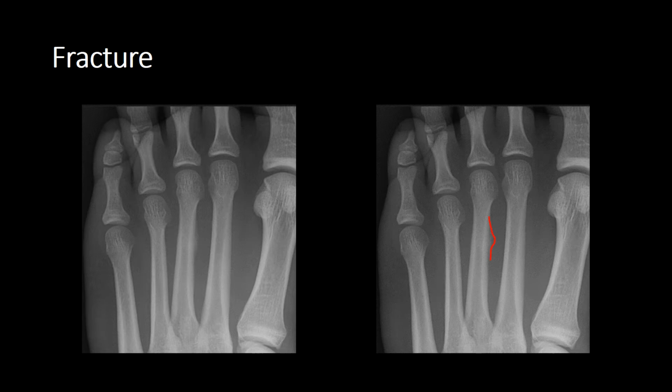What happens is that the body identifies areas of weakness, and so it tries to build up new bone formation to make that area stronger. However, during the process of building new bone formation, in that small window, it's actually weaker. And you get this periosteal reaction where it can be quite fluffy, and you tend to see it on the second and third metatarsals.